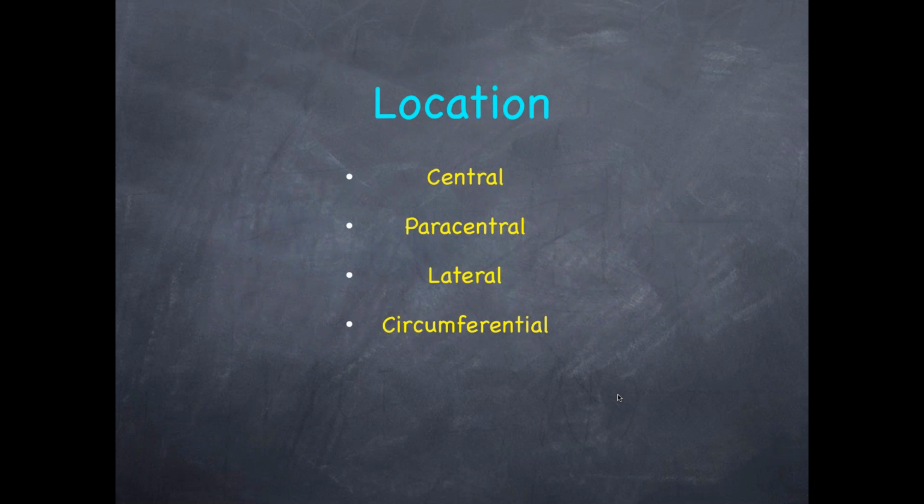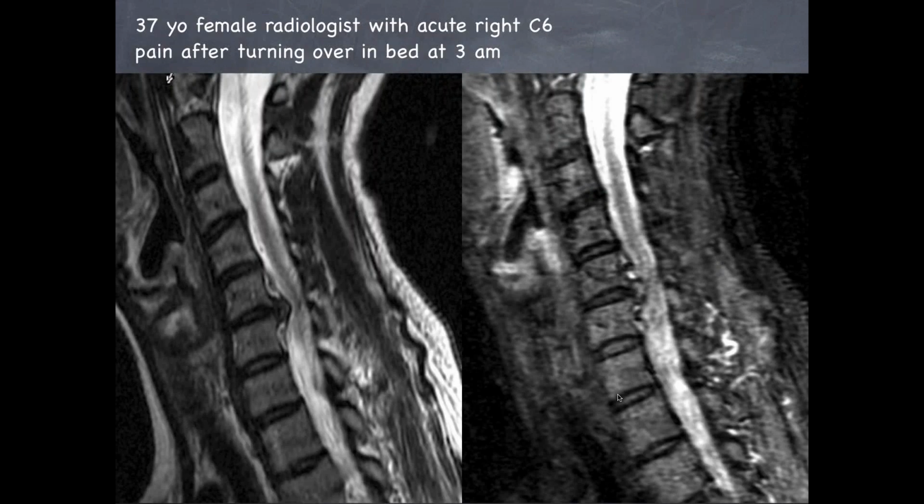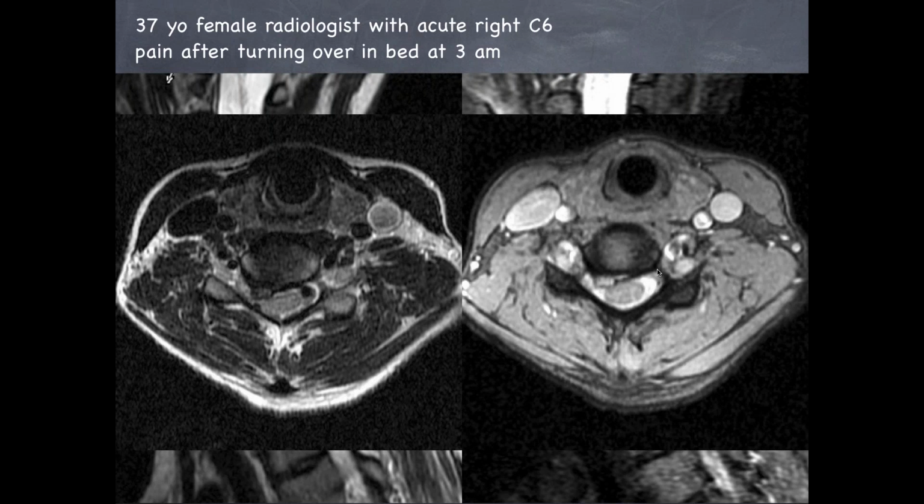Okay, and then we've talked about the location of where they're located. This is central, and here we have another extrusion. It is interesting, if John Yurgudis were on the phone, which he's not, he would ask you what's the most common cause of a disc extrusion, or what's the most common association with a disc extrusion in the cervical spine.